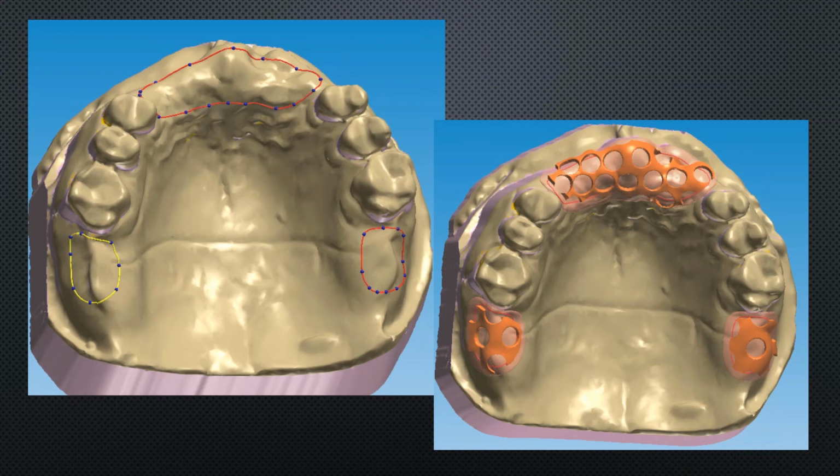It's flexible material. There's two reasons we put tissue stops on a metal frame, and the two reasons are amplified with flexibles. One is during try-in, those saddle areas, you want to be stable, so the doctor doesn't push back there and think there's movement or flex and it's warping, it's not fitting right. With metal, it's going to be fairly stable anyways during the try-in because it's very rigid. With this material, it's going to be very flexible. So you definitely need a nice, robust tissue stop back there to keep things stable during that try-in.